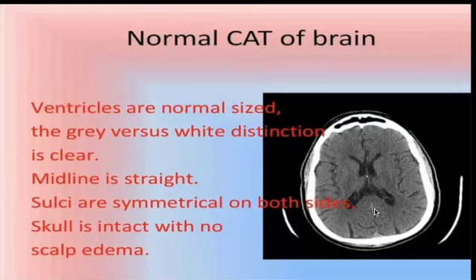So does anyone know any famous condition which has very dilated ventricles? Now, remember, these ventricles are... hydrocephalus. Perfect. So the ventricles are supposed to be filled with CSF. If they are dilated, it means that we are incapable of getting rid of the CSF, or we are producing a lot of CSF.